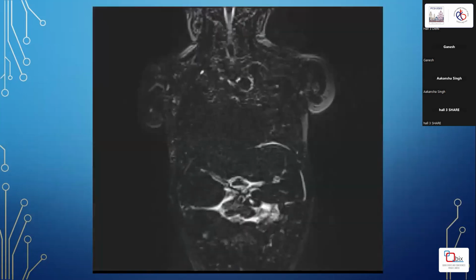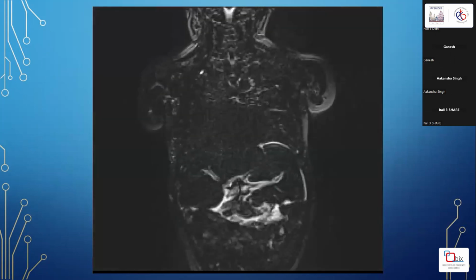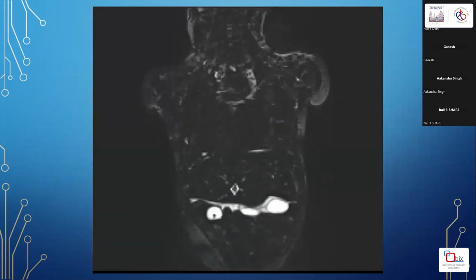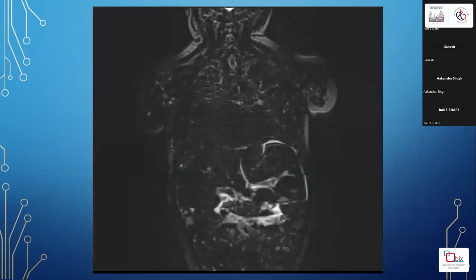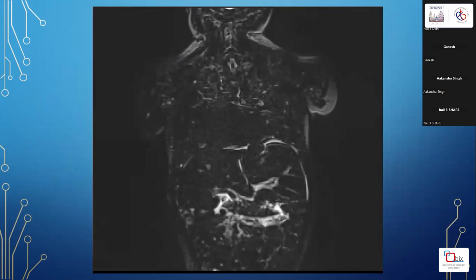This is a T2 lymph sequence that is done essentially to look at the lymphatic congestion, and this showed a pretty bad picture. A lot of increased signal in the mediastinum and the retroperitoneum, and also in bilateral supraclavicular regions and the mediastinum.